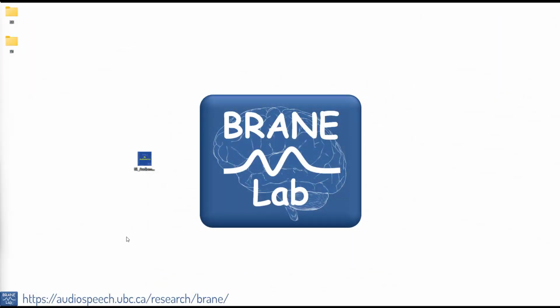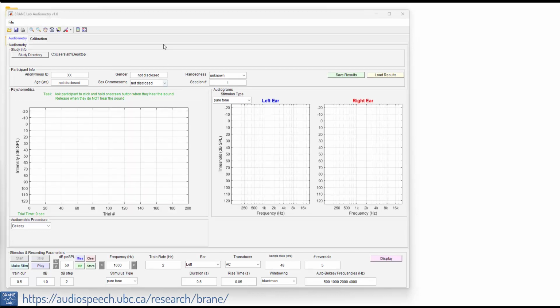Welcome to the tutorial on the BRANE Lab's audiometry software. We're going to be demonstrating today how to do Automated-Bekesy using this software. Let's go ahead and click on that. And we see it pops up here.